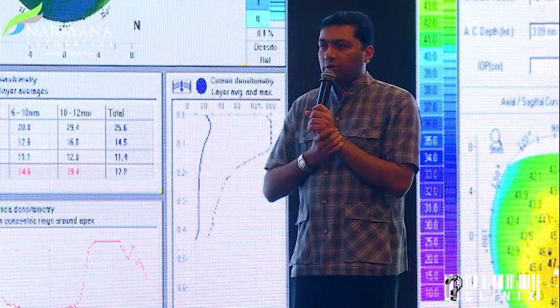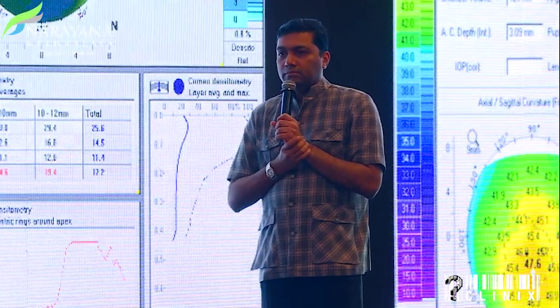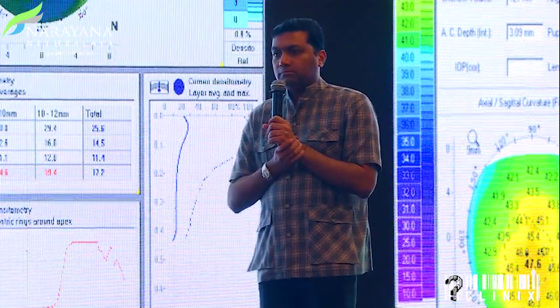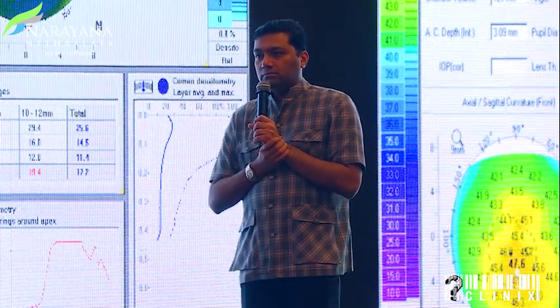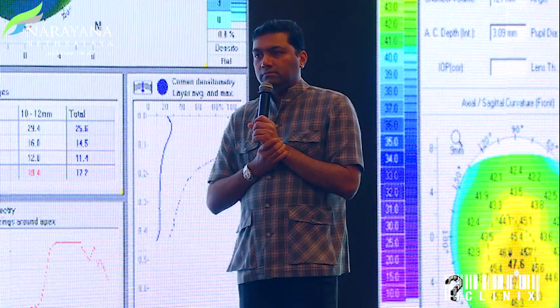If I can address what I thought the person asked, and that is, if you don't have the ABCD, can you use the BAD display for progression? A lot of times I get the question, why can't you just use the BAD display? The BAD display was specifically designed to separate normal from abnormal. It doesn't diagnose. Now granted, we can all diagnose keratoconus with it, but it's really designed just for screening normal to abnormal.